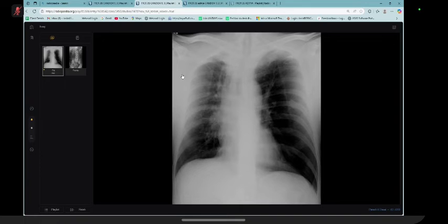Where will you send this patient? Give me a proper diagnosis, what you will convey to the physician. Sir, the first and most important thing was actually the loss of pedicle. The loss of pedicle normally suggests a metastatic lesion, so that should be immediately conveyed to the referring physician.